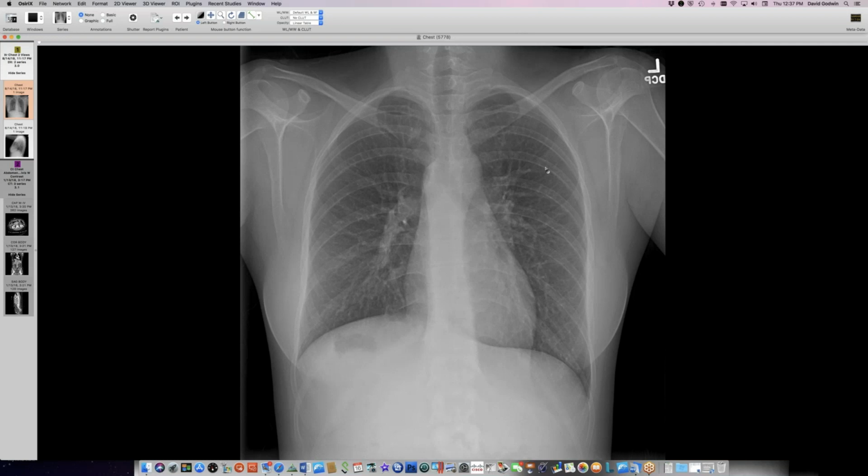There is an interface in the azygoesophageal recess which may represent a distended azygous vein going upwards, perhaps. Mm-hmm. And is that gas in colon, or is it potentially a stomach on the wrong side? I'm just looking at things. But there is something in the azygoesophageal recess, I believe.